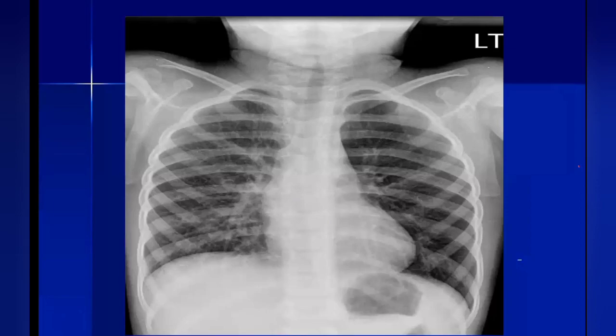This is a chest radiograph, frontal projection, of a skeletally immature patient showing a hyperlucent left hemithorax with a mildly hyperexpanded lung. The right lung appears unremarkable. The cardiac size appears unremarkable. Visualized bone and soft tissues appear unremarkable. On the basis of my findings, it's likely suggestive of left-sided foreign body aspiration.